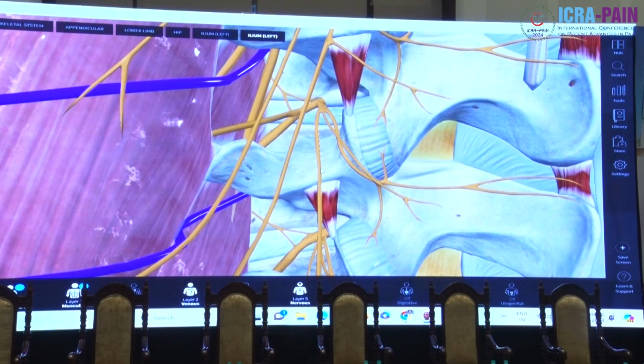And you might be thinking that multifidus is contracting and end up with a failure. So here, the ultrasound has a very important role. If you are able to see which muscle is contracting, then accordingly you can reposition your needle. You can go a little more medially to target the medial branch rather than stimulating the intermediate or the lateral branch. Right?